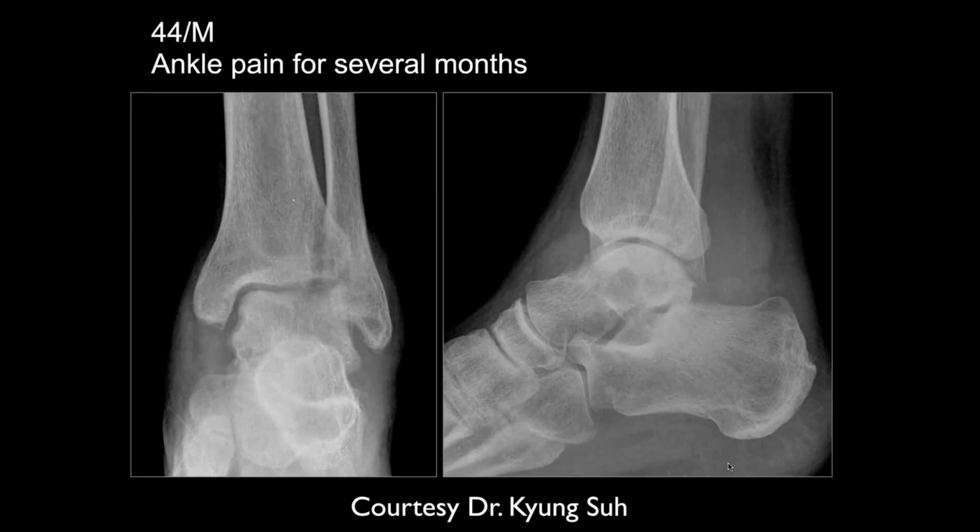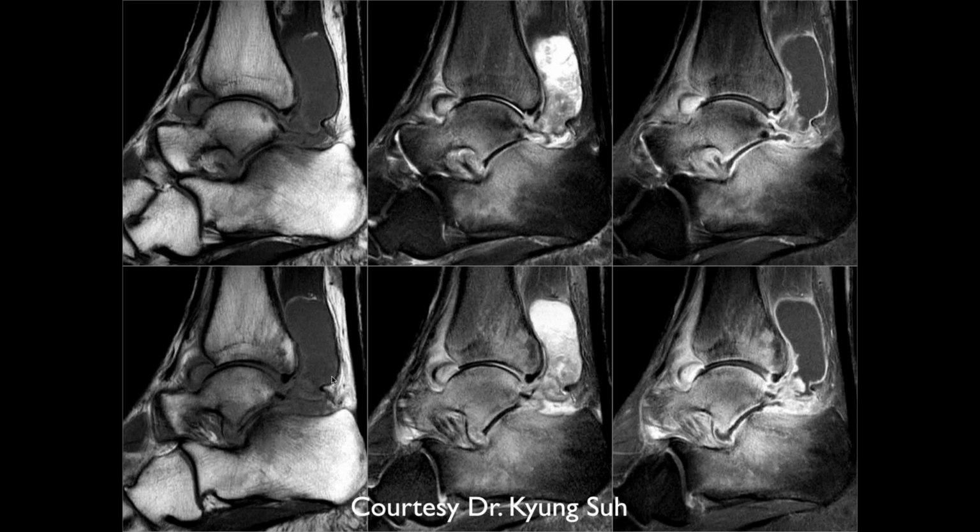Okay, Ashu. All right, so here, especially on the posterior sagittal radiograph, I could see some gas, I believe, within the posterior soft tissues, and I don't know if there's a lucency within the distal fibula as well. Right there, I'd be worried. There's some irregularity. The talus also, I don't see the anterior talar margin very well. I'd like an MRI on this to see what's going on.